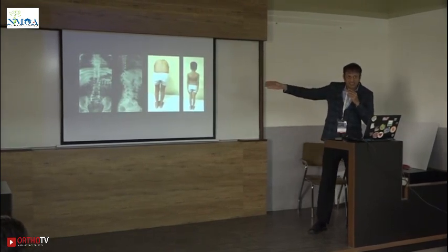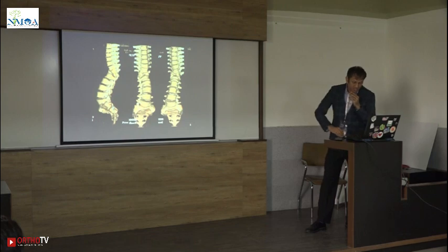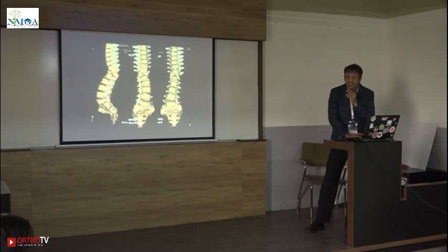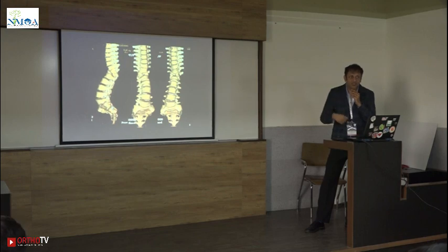In these children, it is absolutely necessary to have a CT scan just to know the anatomy of the vertebrae, and here you can see he has a hemivertebra above and a butterfly vertebra below. This is where CT is of utmost importance, where you cannot understand the actual anatomy, especially in these kids who are scoliotic at an earlier age, less than 10 years.